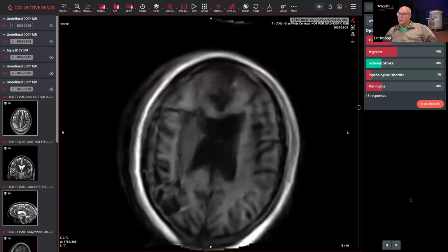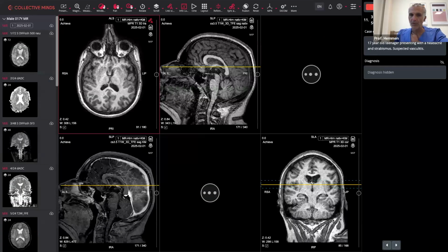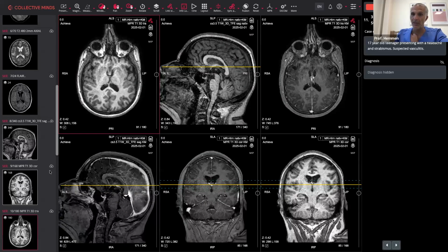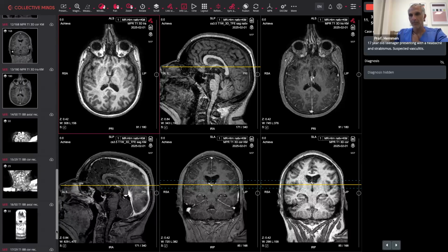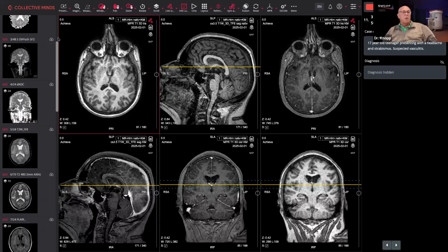So let's go on to the high field. Yeah, and what you just said, Eddie, is absolutely important. What is obvious now from this image is that I don't need to call the neurosurgeon immediately at 3 o'clock in the morning and say, we've got a problem here, you have to help me immediately. And I think this is also very important. No, absolutely. You rule out all of that severe acute abnormality.